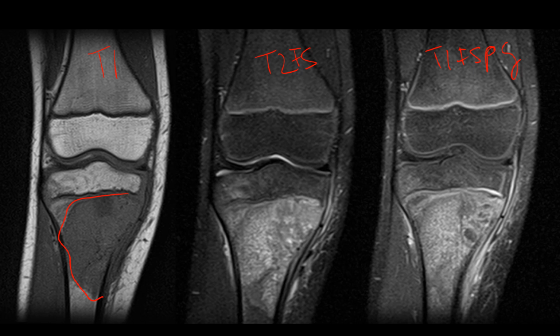So that's why we still use the radiographs to describe the behavior of lesions in the bone, because it may be a little bit deceiving on the MRI in terms of the border. But we can see there's cortical breakthrough here medially, and we can see there are some regions of necrosis. So a very aggressive lesion, and we usually do MRI for staging, to see if it's crossing the articulation, see if we see any skip lesions here in the distal femur, or across the articulation, or anywhere in the bone in the tibia that you could see.